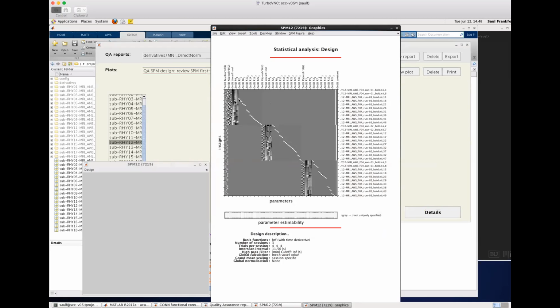It's an added regressor for each of the ones that have X. And the one that you looked at before was grayed out for a portion of it. This just happens to be estimable, so it doesn't have enough to be totally non-estimable, the effects that you care about, but that's perfectly fine. Unless you care about session-specific effects, you don't care about that, basically.